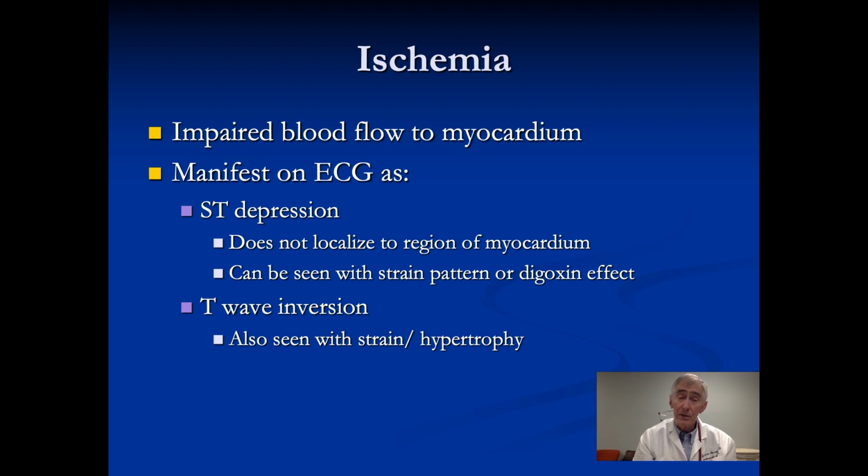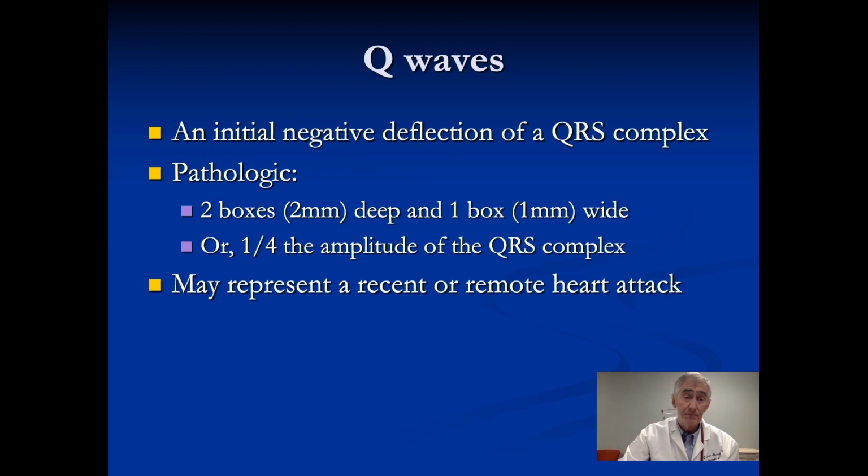We can see it with digoxin effect, and we have already seen ST changes with repolarization abnormalities with the bundle branch blocks. We can see T-wave inversion also with strain, hypertrophy, and bundle branch blocks. So you'll sometimes also hear nonspecific ST wave abnormalities, which we won't pursue further here.